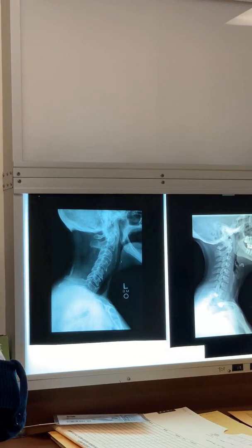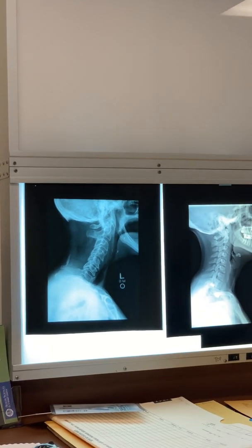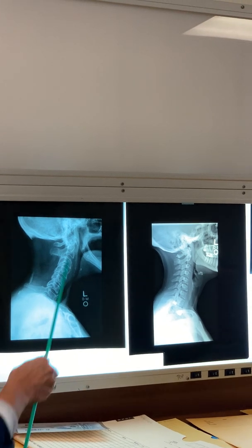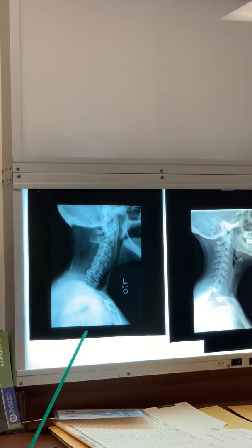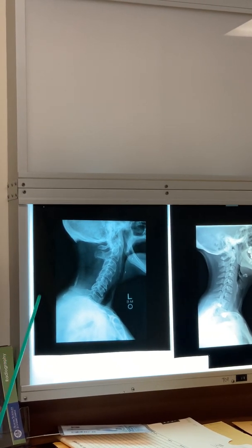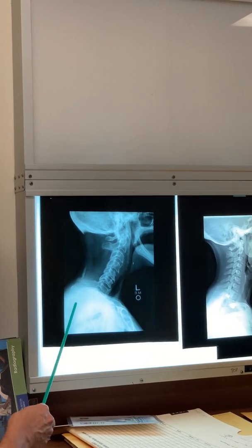Do they have teeth? No teeth. Dentures. It is a very old person. Yeah, and it looks like they approached anteriorly. I don't know. They had surgery. They have staples. I didn't write it down. Probably post surgery, right? Yeah. I'm missing a lot of stuff.